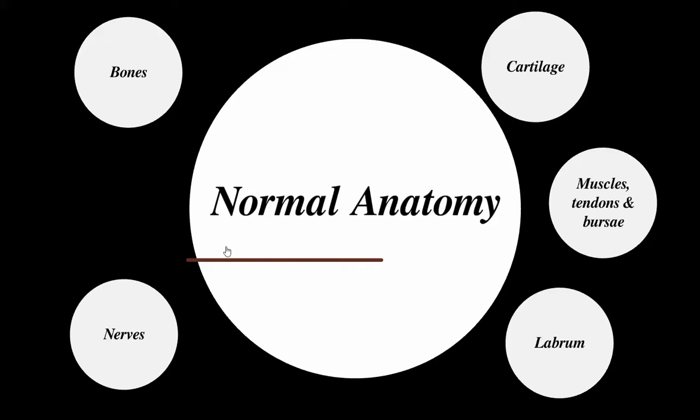The intra-articular contrast distends the joint, separates the soft tissue structures, unravels the compact labrum, and increases the contrast resolution, all of which help to increase the conspicuity of intra-articular pathology such as labral tears, osteocartilaginous loose bodies, and osteochondral and cartilage defects.